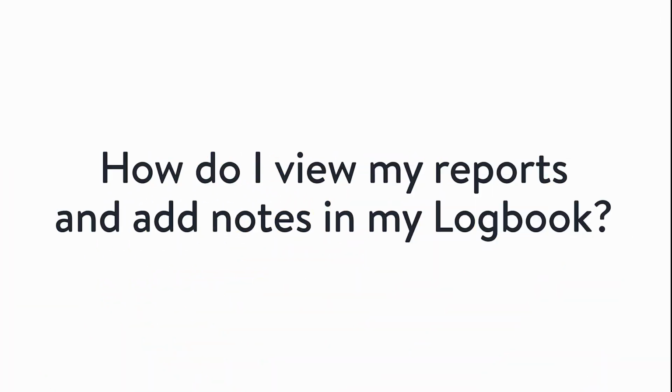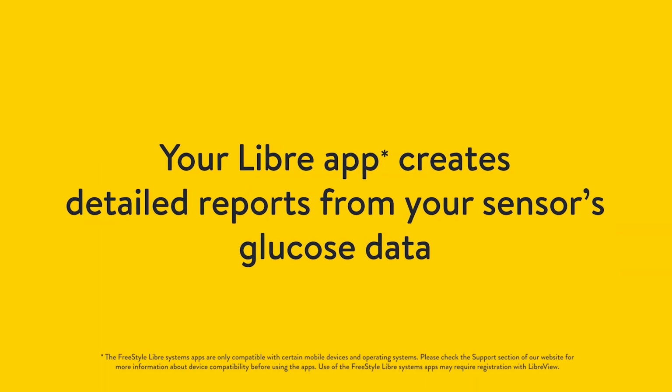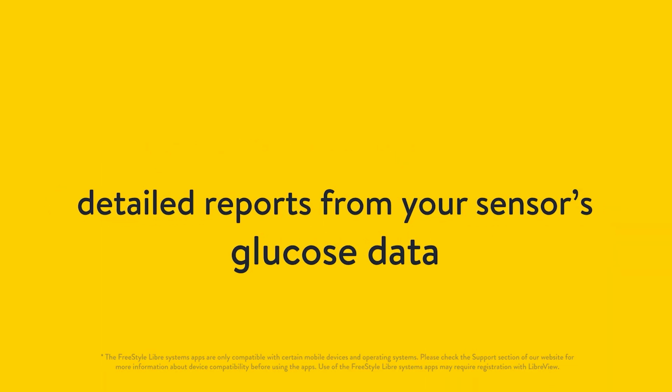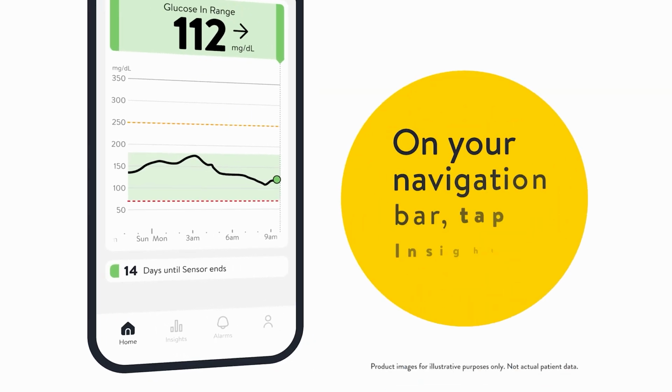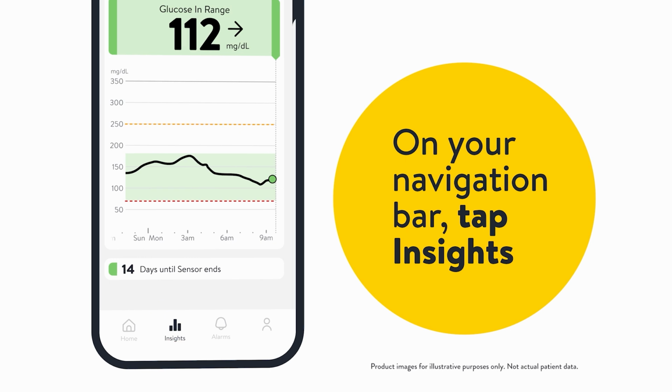In this video, you'll learn how to view reports and add notes in your logbook. Your Libre app creates detailed reports from your sensor's glucose data. These reports can provide valuable insights. On your navigation bar, tap Insights.